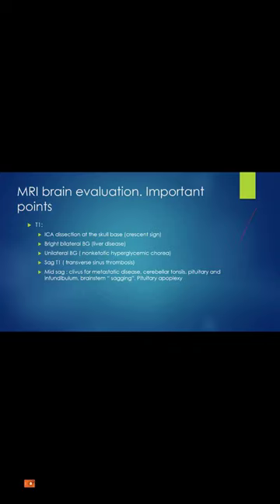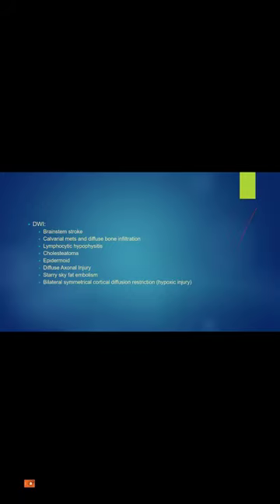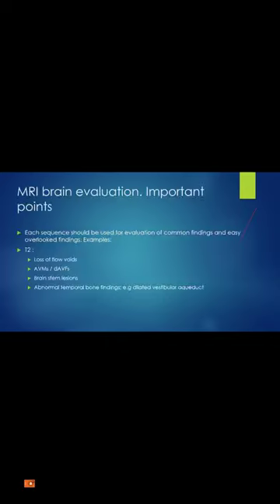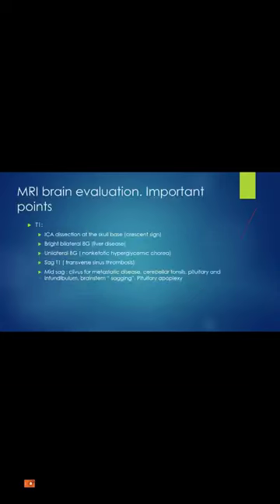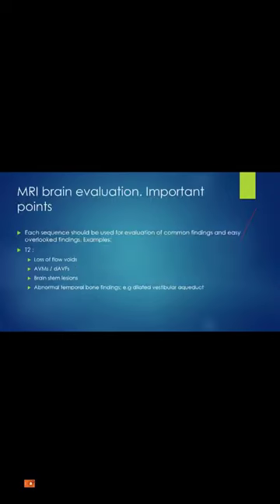Please, the two slides before this picture. Les deux derniers, l'avant, before this, before the diffusion, the T2. Yes. Thank you. Loss of flow voids, AVM. Thank you. Okay.